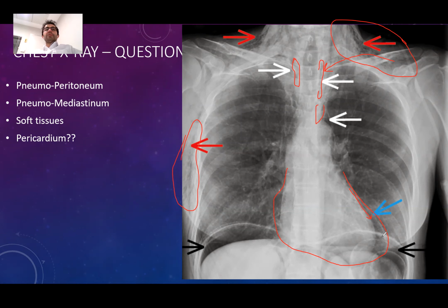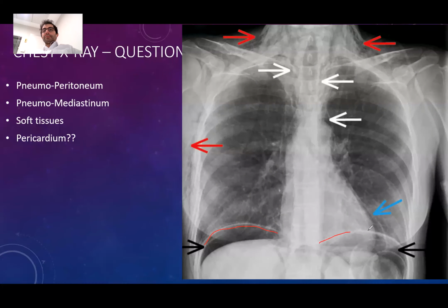This is probably not pneumopericardium, but also in this patient we are seeing free air under the diaphragm as well, right? We are seeing free air under the diaphragm too. Okay, let's move on to the next one.